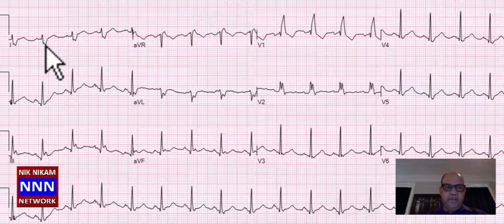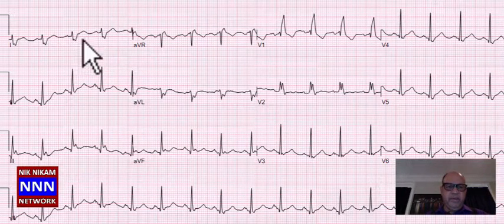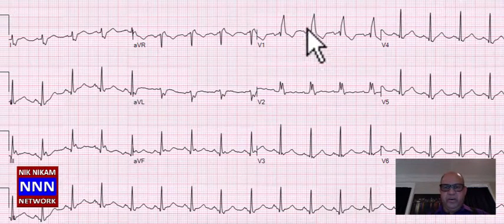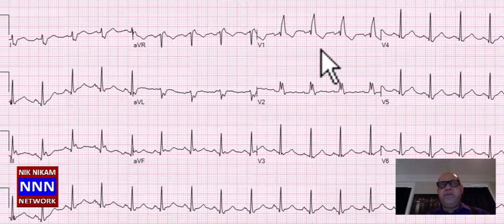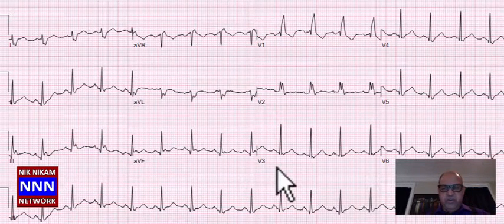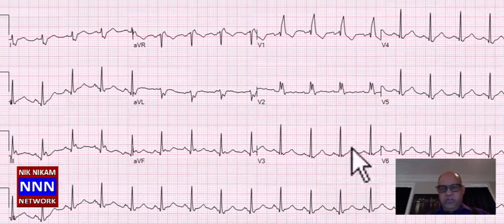Again, right bundle branch block. The moment you look at lead 1, you should be able to say this is right bundle branch block. I don't even need to look at this classic rabbit ear or RSR prime, and it involves more than 3 boxes. So this is a definite complete right bundle branch block. So that's what we are dealing with. Along with that, we have some non-specific STT changes and non-diagnostic Q waves in the inferior leads. The lateral wall looks okay.